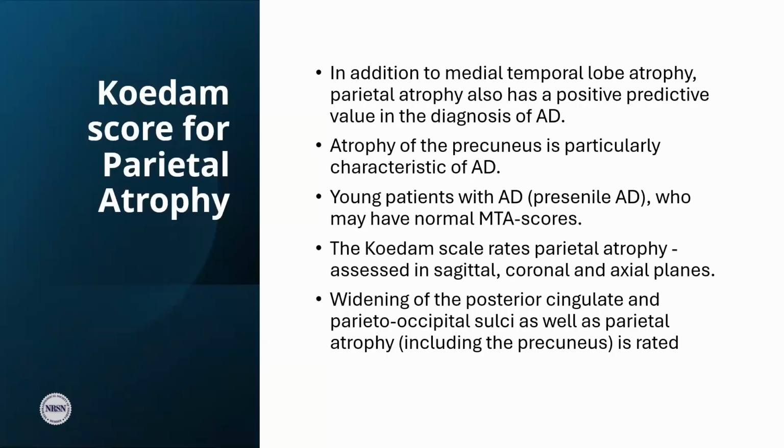The Koedam score, in addition to the MTA score, parietal atrophy has also been found to have a positive predictive value in the diagnosis of Alzheimer's disease. So there's characteristic atrophy of the precuneus, and it's also seen that young patients who may have Alzheimer's can have a normal MTA score. So if you use the Koedam score for these patients, we're able to actually single out those that have amnestic mild cognitive impairment that will convert to Alzheimer's disease.